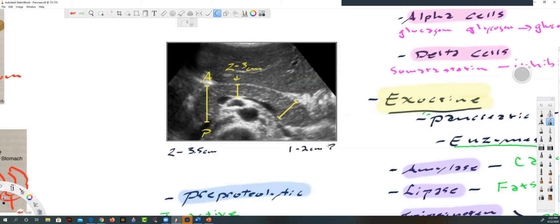I am going to put a question mark on that, because this is a beautiful picture. You guys, this is the hardest organ for us to see, by the way. I don't think I mentioned that. We're seeing this one beautifully because, one, it's definitely a thin person. It's probably a kid, and there's liver sitting right on top. There's no stomach in between here. There's a little bit of stomach right here, but that's a beautiful picture. It's usually not this good.